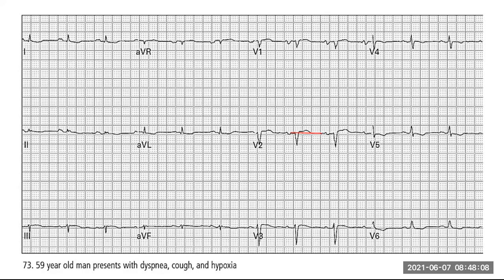Now, the question is, why do they say left atrial enlargement? This is not particularly P mitrale and P pulmonale. We'll get into them again. When you look at your P wave, let me just draw this out. Hope it will allow me to try. So we're just going to imagine a P wave like this, because I can't get a curve. The first part of the P wave is your right atrium.